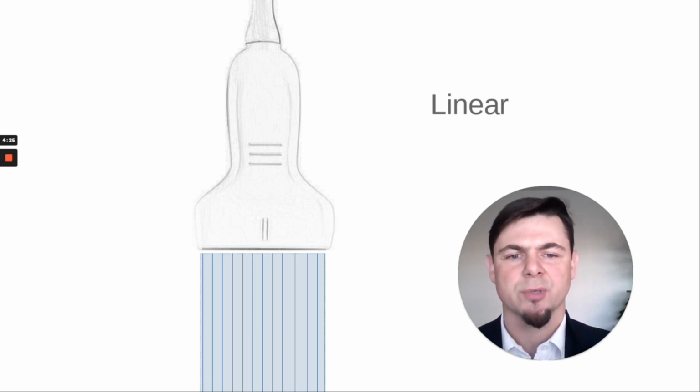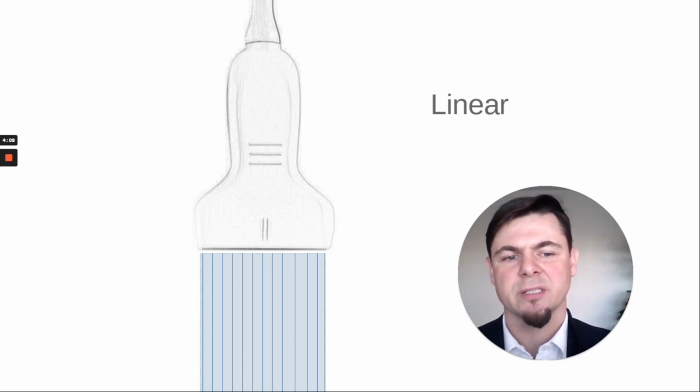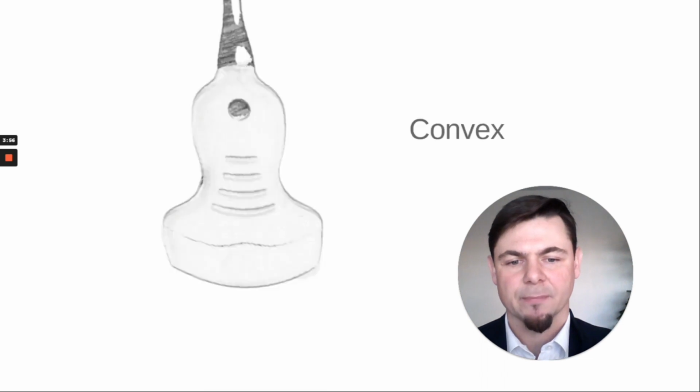Also, we use this probe for Doppler examination. As a distinction between linear probes, for Doppler examination we use up to 11 MHz, more or less. For general examination about 14 MHz, and for examination of surface structures, high frequency is around 19, 22. Some companies propose even more megahertz. I can say a lot about this type of probe, but not now, so let's go next.